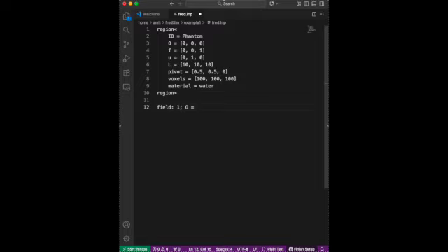So all those have to be defined initially, and that cannot be defined at a single point by just giving a point and then defining a lot of protons coming out of it. We have to define a matrix. That matrix will take care of the spread, angular spread, the beam spread, the divergence or convergence, the emittance, all of those things.